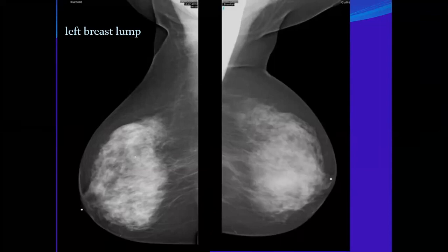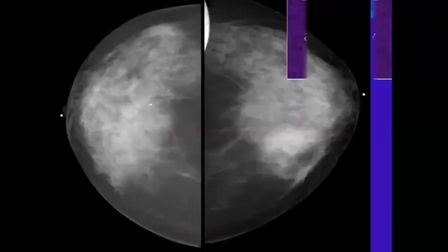We spent how many hours talking about the quality? Yes, this is very essential. You see? This is a suboptimal mammography, and might be the patient refused, or I brought it for that reason. Okay, this is the other view.